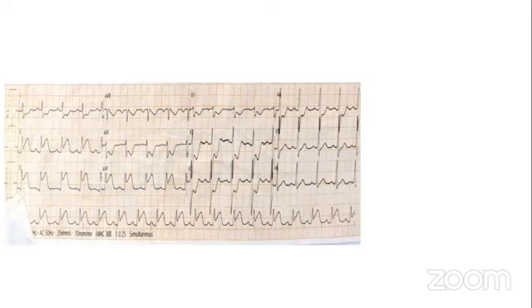this exactly, because this ECG is not only inferior, but it also hints something grave. And also look at the amplitude, because the degree of the ST elevation. But what I mean is that you have the patient in front of you. How does the patient look? Is the patient hypotensive? Is there any murmur? Is there any shock? Predict this, because it may be already in a bad situation.